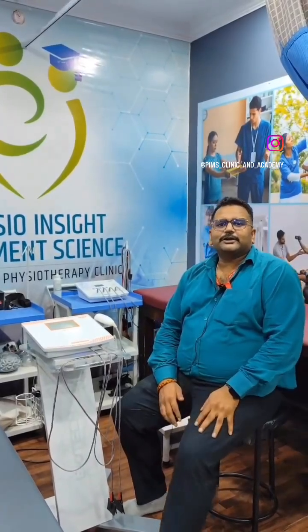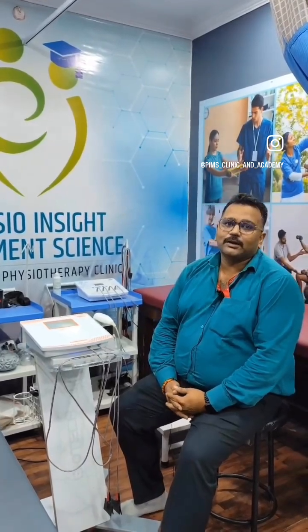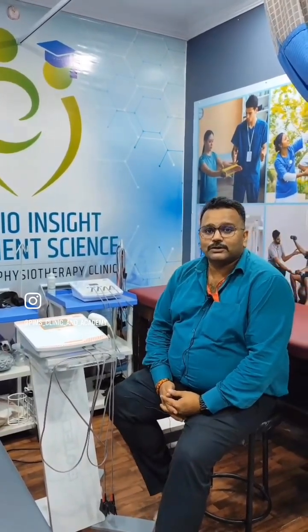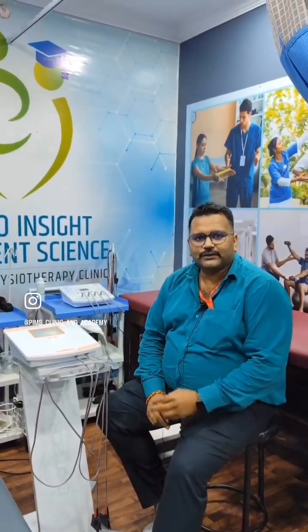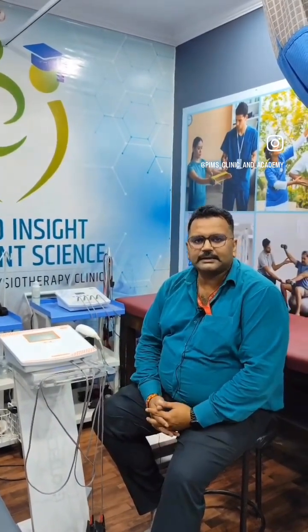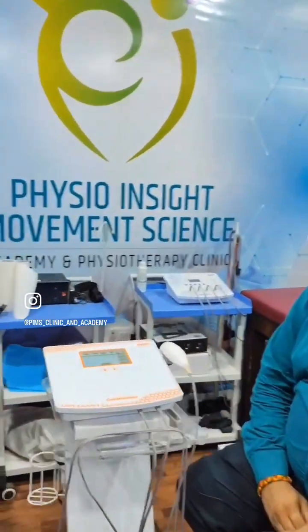I am here today to discuss physiotherapy equipment, that is ultrasound. Indeed, that is the most used physiotherapy equipment worldwide. Ultrasound has two frequencies which we use for therapeutic effect, that is, one is 1 megahertz and the other is 3 megahertz. Apart from these frequencies, there are some other factors also which you should know. So we will have a close look at this equipment.